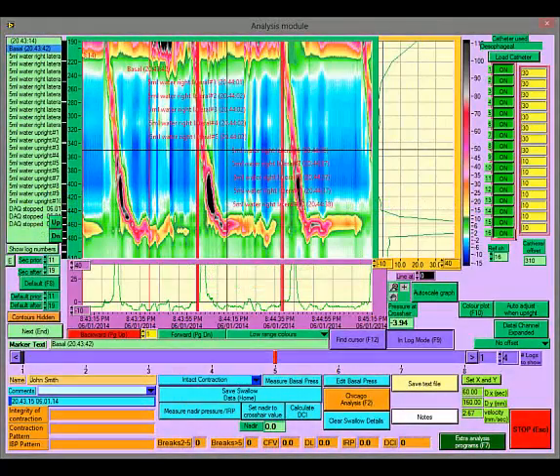Trace offers two methods of analysis: a simple analysis based on measurement of nadir pressures and routine swallow classification, or a method based on the 2012 version of the Chicago classification. In general, I would suggest that you select and use one method per study, as if you mix the two methods of analysis, Trace will assume that you are using the Chicago classification and measurements, and swallows that you have saved where you have used the simple analysis may make the results of this unreliable.